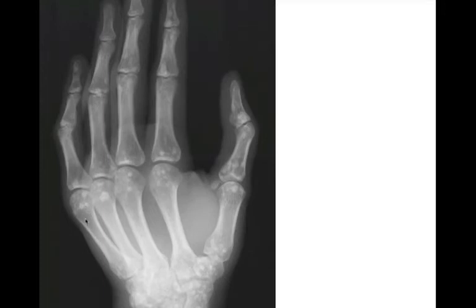All right, radiograph of the hand showing multiple of these punctate sclerotic densities all throughout the hand and wrist. So typical appearance of osteopoikilosis, look like little bone islands. You don't need to go to further imaging. You see this, this is really pathognomonic for osteopoikilosis. There's no malignant potential for these.